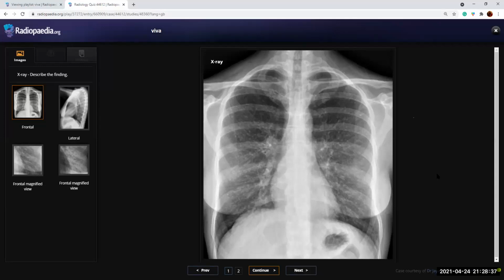This can be healed varicella pneumonia, is a possibility. I'll compare the previous images and we'll check for any clinical information whether this patient had any varicella pneumonia, or it can be old healed granulomas also. This patient had a previous X-ray with similar images. So I think healed varicella pneumonia is a possibility. What will you do? This actually needs no treatment. I'll compare the previous images, and you told that it is stable. If the patient is asymptomatic, nothing is to be done, and I'll report it like that.